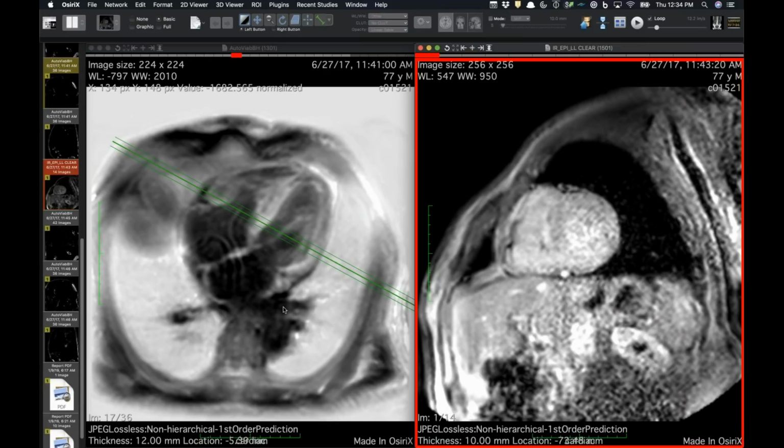Yeah. Sometimes, even in my old reports at Maryland, because we saw this quite frequently, I would say, you know, tiger or zebra stripe pattern may represent amyloid, may represent this subtype. Yeah, most likely ATTR as opposed to AL.